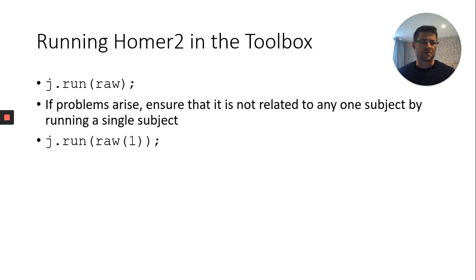If you have any problems arise when running it, the best thing that I've found is usually that it has to do with a single subject. One subject has a different montage, a different number of conditions or tasks or something like that. So if problems arise, usually my way of going through it, I don't usually have a large number of subjects, and usually each subject is me anyway. So I will go one by one through the subjects, or chunk them into subjects.